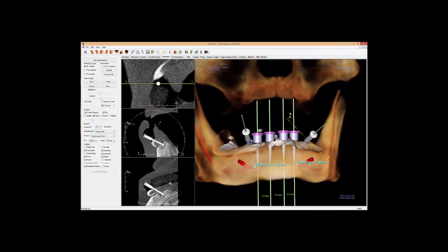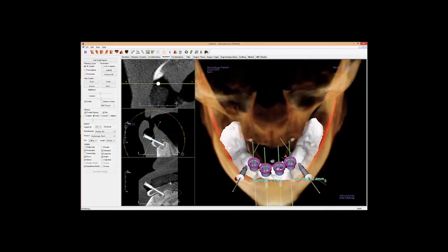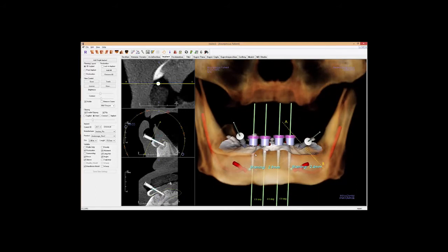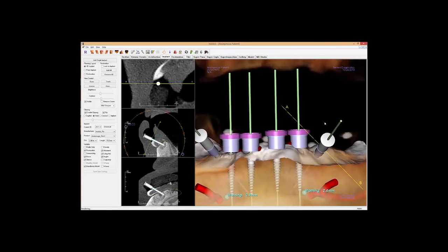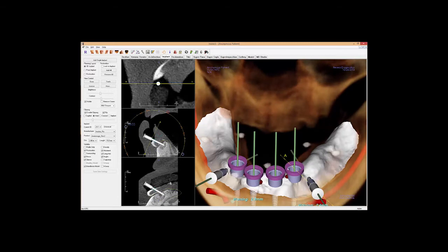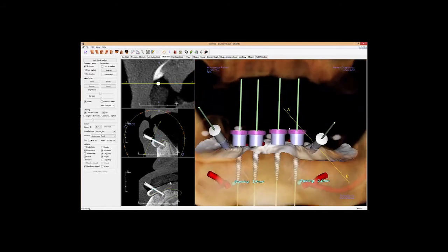Just as when we're planning for the denture, we can't have these implants too close together. The same is true with the surgical guide. When they create the guide, they embed these sleeves, and if they are too close together and we won't have access, that can be a restriction.